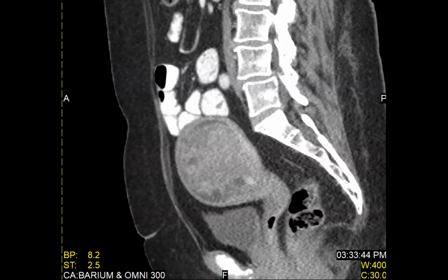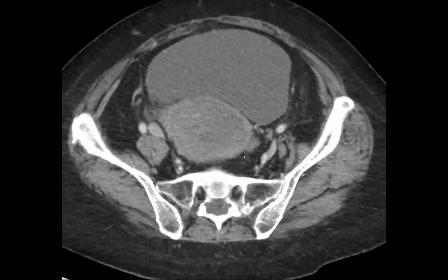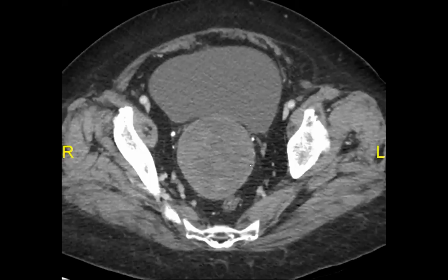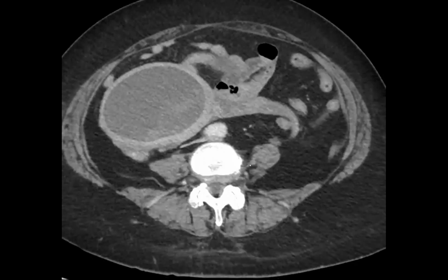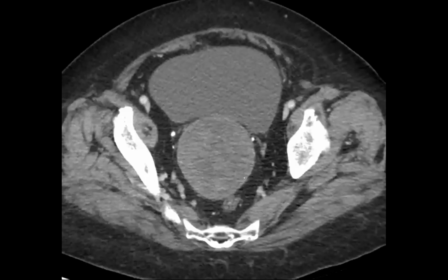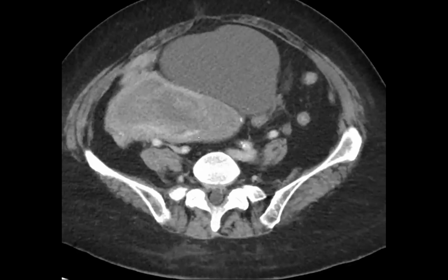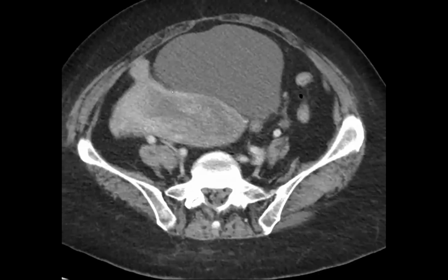I don't know what happened, but 5 months later, the patient gets a CT somewhere else again. And this is that scan. You can see that. Wait, has it grown into the fallopian tube now? Or there's kind of an obstructive process, maybe there's fluid upstream.